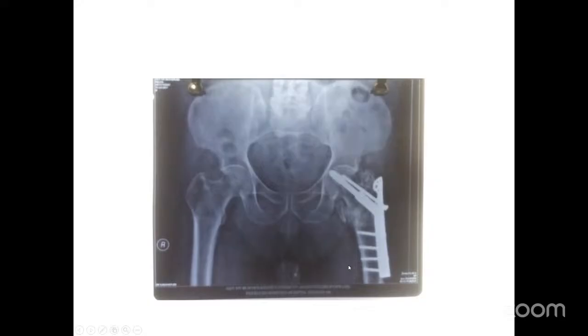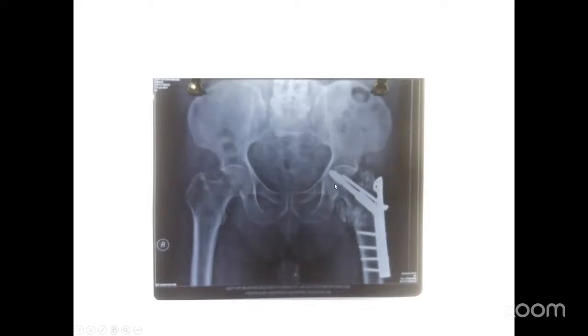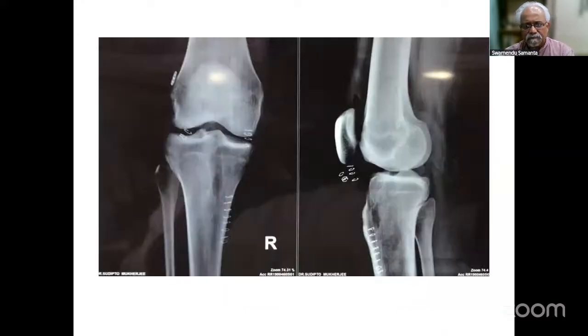Somebody told that this is an FNS, and I told you that this is a very gross mistake, because this X-ray picture is never anywhere close to the femoral neck system. This is a very common and basic implant. Not only in the X-ray you will find it, definitely it will be on the instrument table, and you have to read in detail the thread diameters, the bore diameter, the barrel length, when to use the trochanteric stabilization plate. I am not going into the theory part, but you must know where the trochanteric stabilization plate is being used.